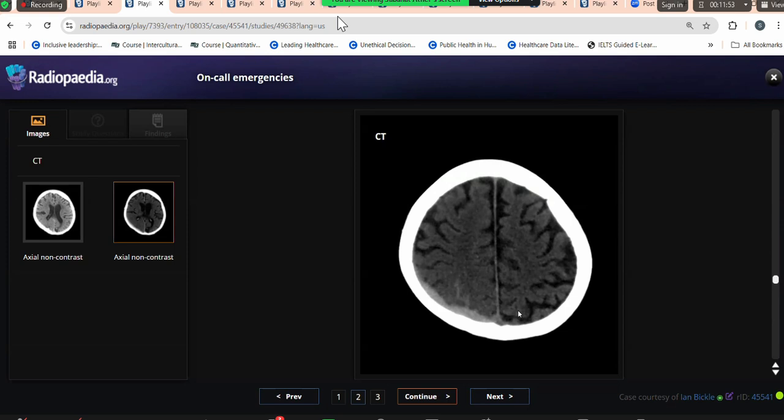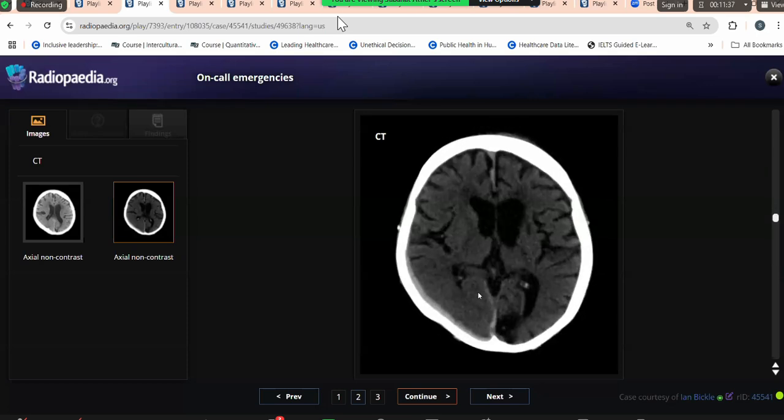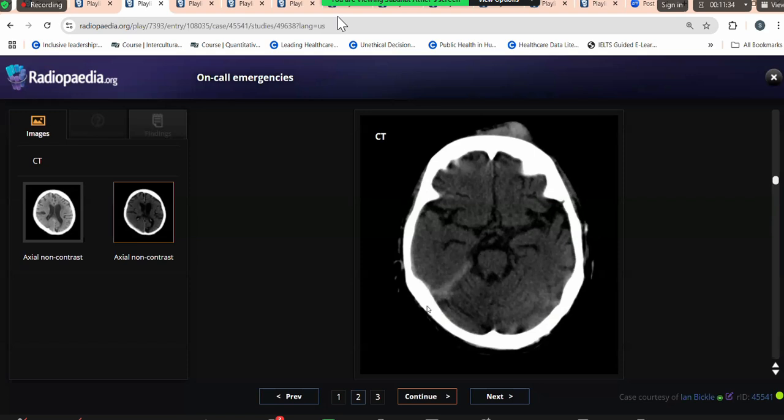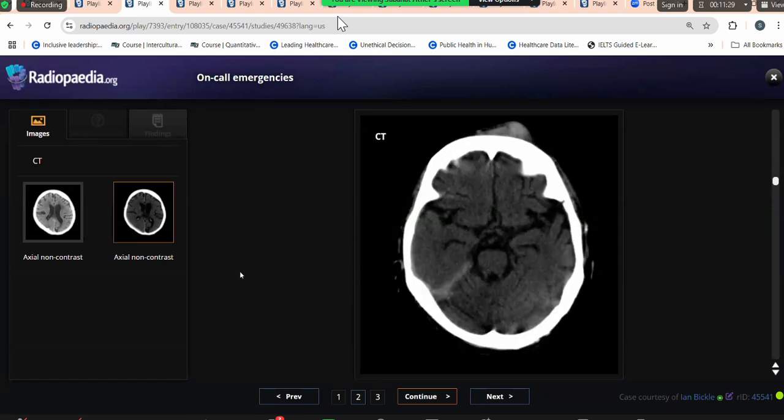Once you alter it, I think as the candidate told us, there is right-sided subdural hemorrhage, very obvious. There is the subarachnoid hemorrhage, very nicely told. She also mentioned the hematoma in the frontal region, and I do remember she told about the tentorium cerebelli as well. So all these things have been mentioned, and I want all the candidates, all of us, to say in the beginning that we are looking at the CT brain for a patient with neurological deficit. I would like to scroll it in the stroke windows, and things would become simpler.